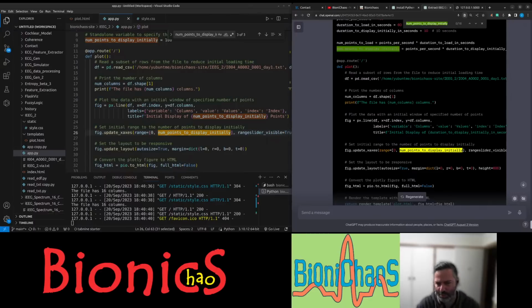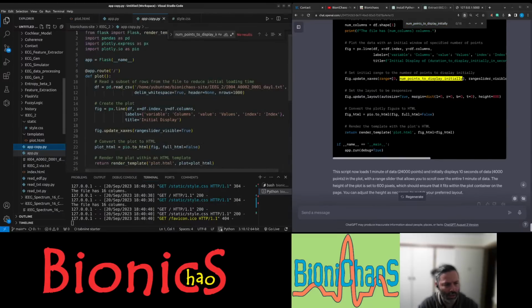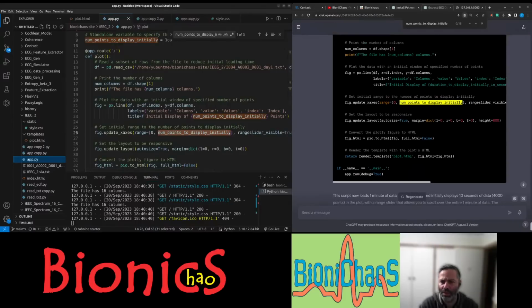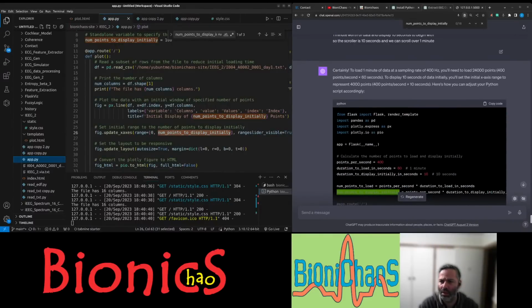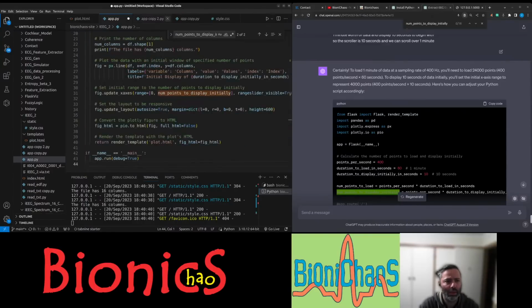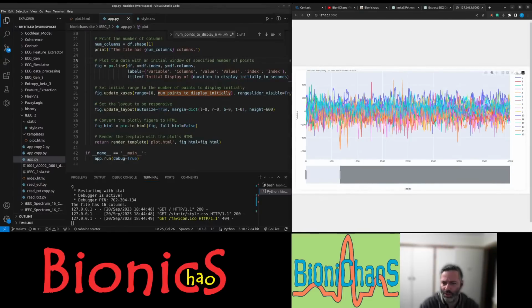It seems legit. And we can just test it. Refresh.